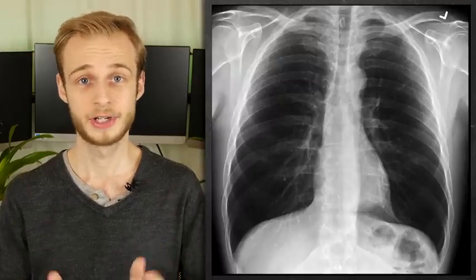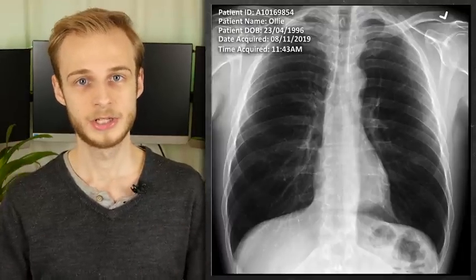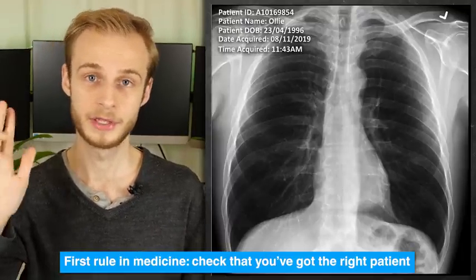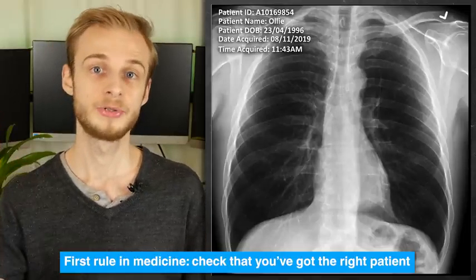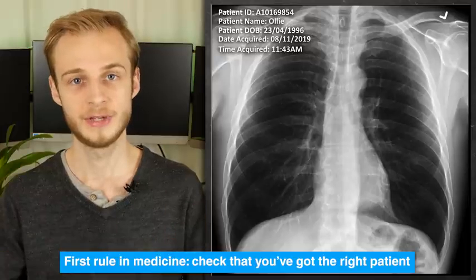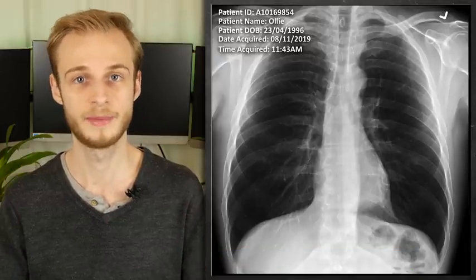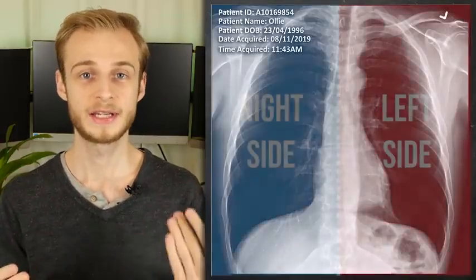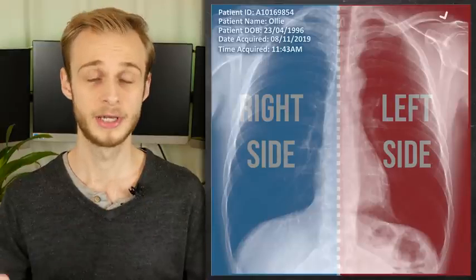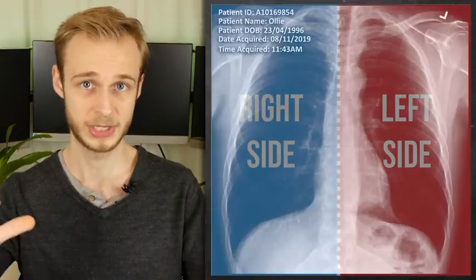The first thing we're going to check is the patient details. Are we looking at the right person? So you need to check their name, their date of birth, the date the x-ray was taken, potentially where it was taken. And you may also wish to note that you could compare the imaging you currently have in front of you to any previous images or other information that's available. It's also really important to remember before we move on that an x-ray is horizontally mirrored, with the person's left side being on the right side of the image as you look at it.